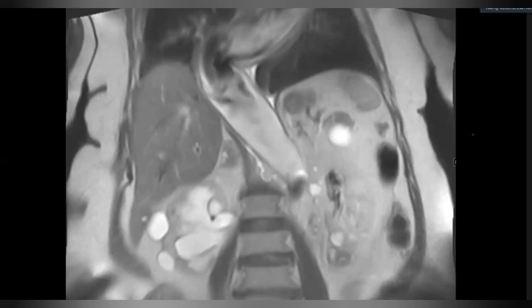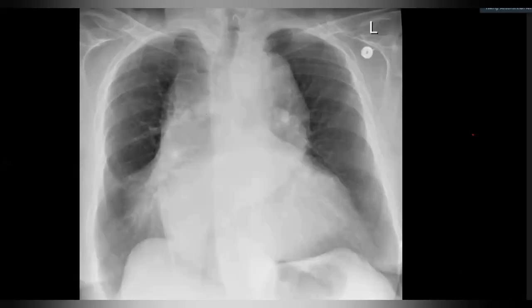Okay, so based on this, the person obviously had an MR for something completely different. This was picked up on the scout view. This finding that we're going to go through and eventually come to a conclusion was picked up on the scout view of this MR. So then the chest X-ray. This is a chest X-ray done subsequently. Tell me about this chest X-ray.